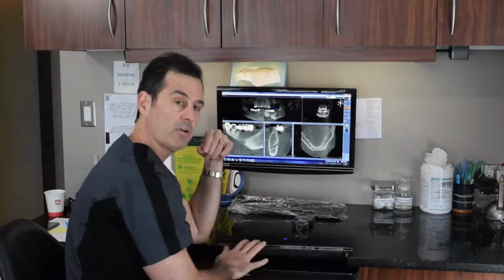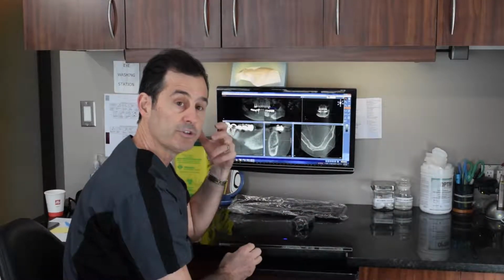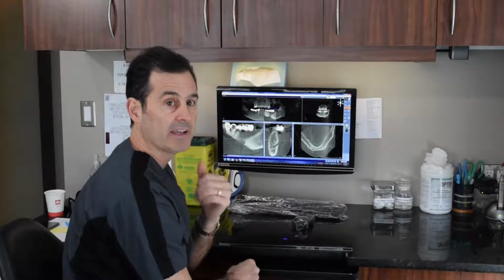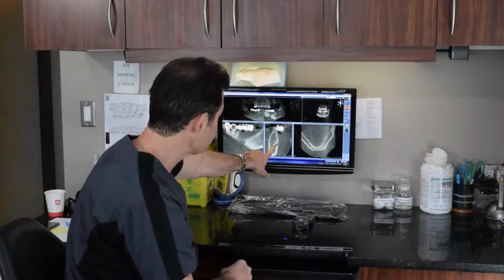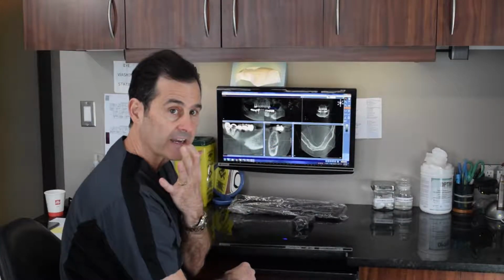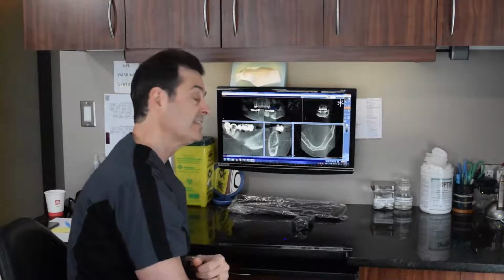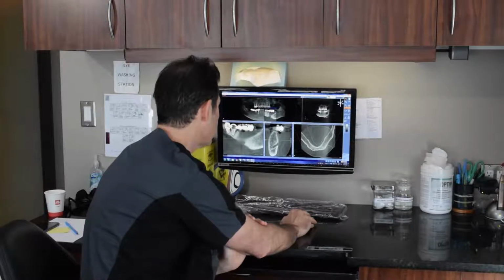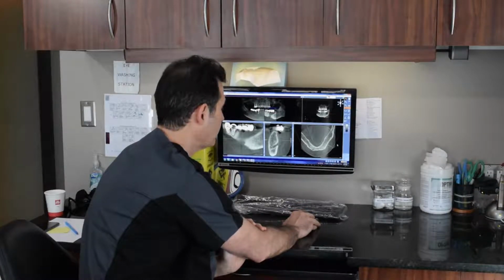This is the nerve that when we're doing dentistry on the lower teeth, that's the one that we numb up. If we were to damage this nerve in surgery, you would be left with a permanent numbing of that lower lip. Obviously that is a very bad thing that we don't want to do. So what we're going to do is mark out where the nerve is before I start planning out all my implants.